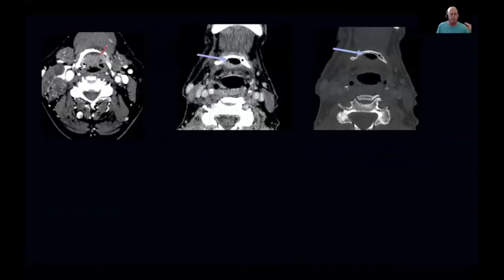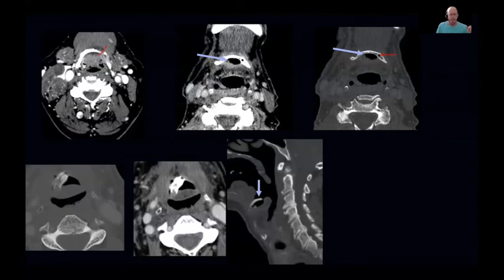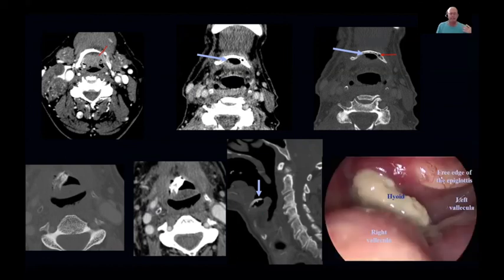This patient was radiated for the low tongue base or vallecular cancer that you see here, and developed the usual exposure of the hyoid. There may even be some air in the hyoid. Air in bone is, of course, bad. And this patient's hyoid eventually fragmented and pierced the epiglottis and essentially presented in the vallecula.